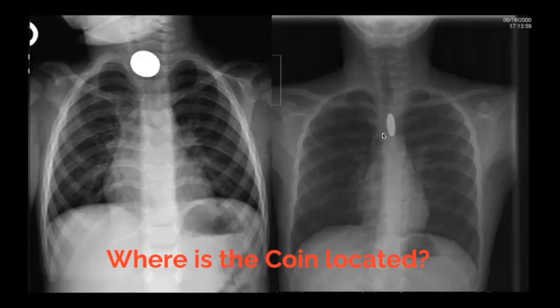It will be vertical, like the case on your right. So it is safe to postulate that in the patient on your right, the coin is located within the trachea, and in the patient on the left, the coin is located within the esophagus.